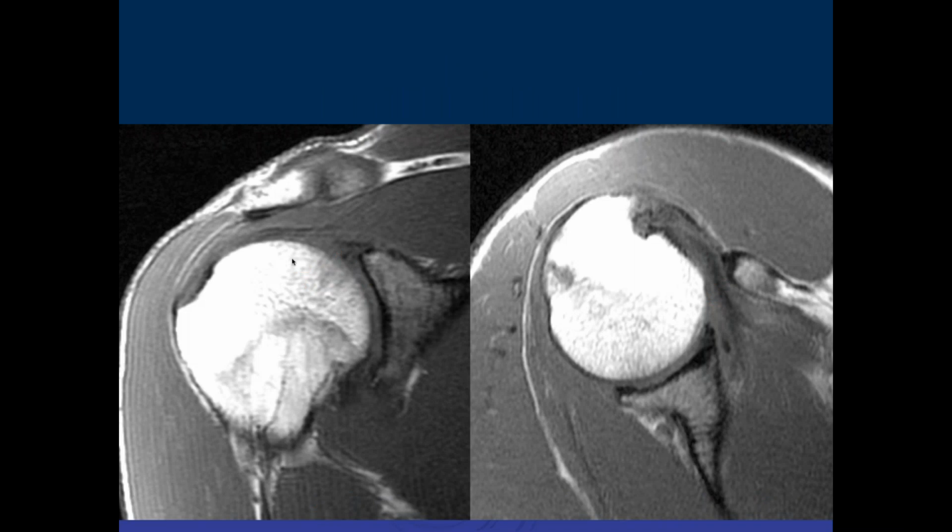Okay, so we have the superior labrum is very degenerated. So there's a tear, a degenerative tear. Yeah. What about the biceps anchor here? So the biceps anchor, if that black line is part of the biceps. It's part of it. Yeah.